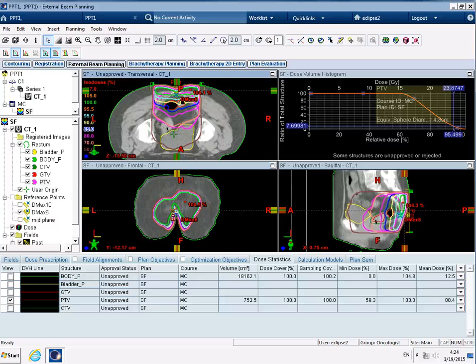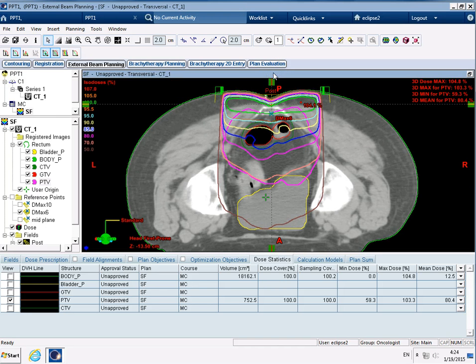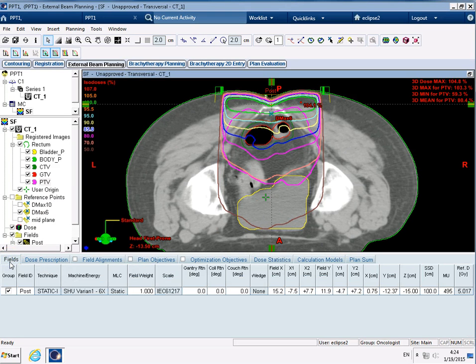Okay, so as we've discussed, another way of increasing the dose would be to increase the energy of the beam. Okay, so let's have a look at changing the energy of the beam from 6 MV to 10 MV. So I want you to do the same as we've done before in terms of looking up some of the figures that are involved in it.